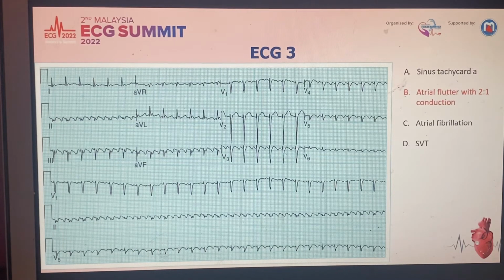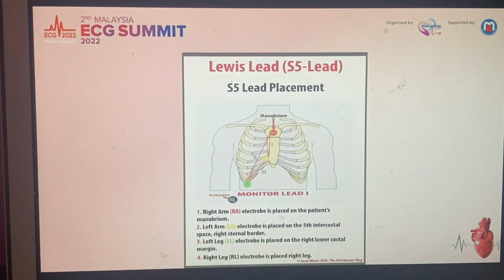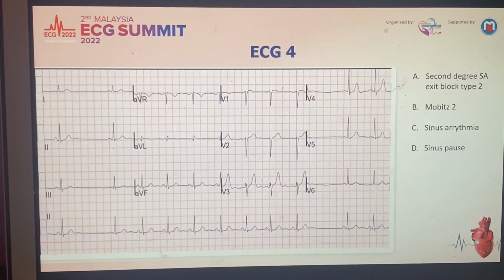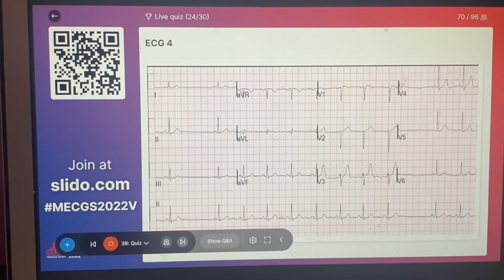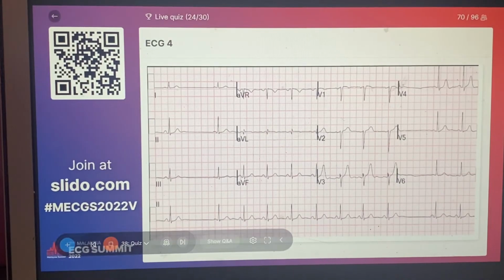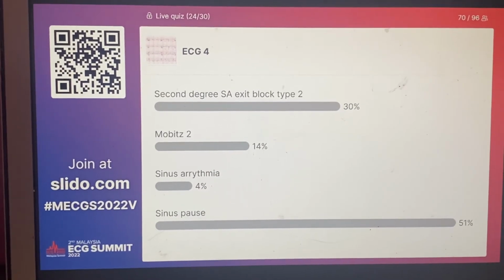All right. Next ECG. Okay. Can I see the whole? 51%. Yeah, half of you answered it as sinus pause.